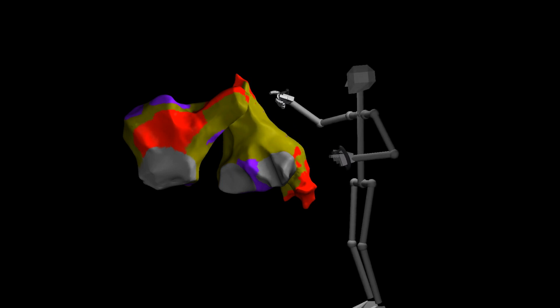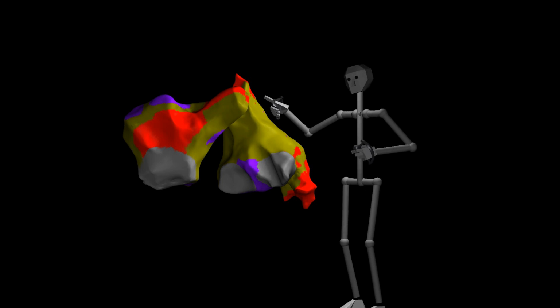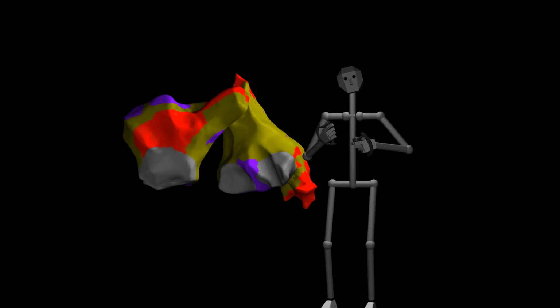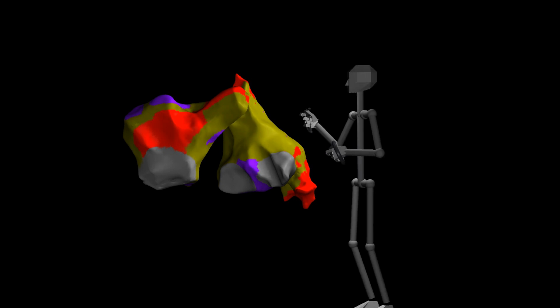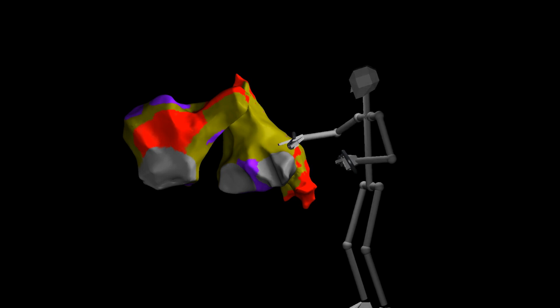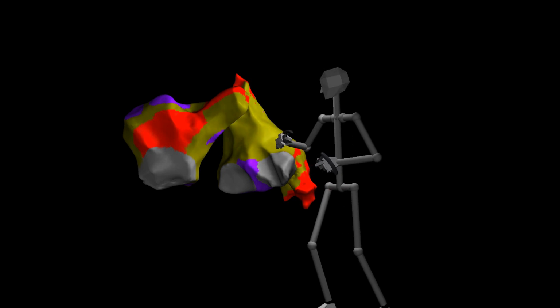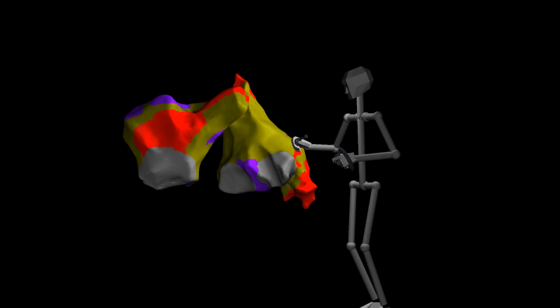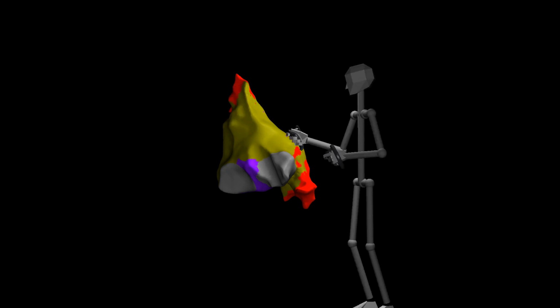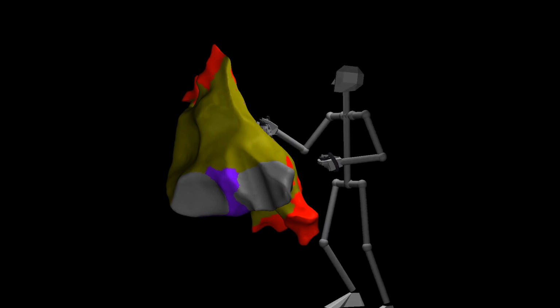And also the catheter recorded the voltage that was expressed and measured at the surface. It recorded multiple values, including unipolar and bipolar voltages. In this case here, we are looking at the bipolar voltages. This here is the patient's left atrium. This over here is the right atrium. This was the primary target of the procedure, the cryoablation procedure. I'm going to hide the right atrium so we can focus on the left atrium here.